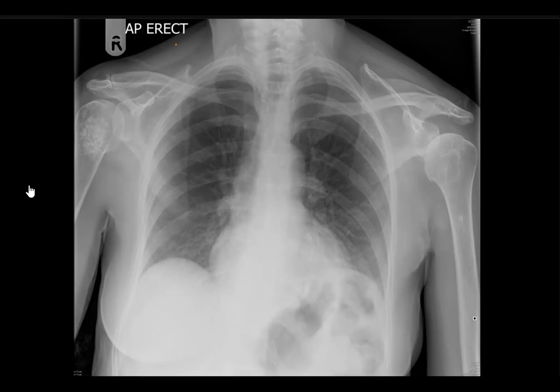Subluxed, very good. By the way, for practice, if the humeral head is displaced inferiorly only or inferolateral, there is effusion. It is not dislocation. It may be inflammatory effusion like rheumatoid arthritis or post-traumatic. Dislocation is inferomedial, not inferolateral. So this is some subluxation, likely by effusion.